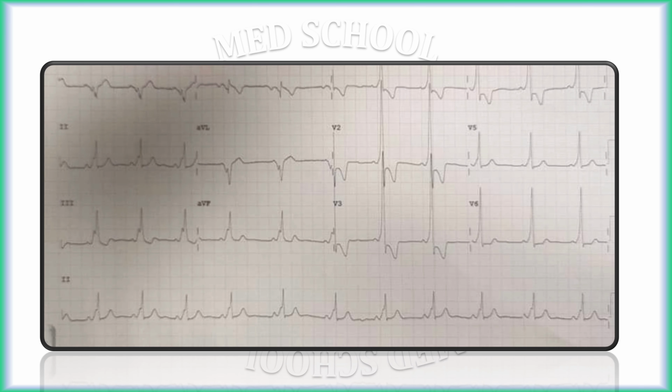This is also an ECG of WPW syndrome. There are ST depression and T wave inversion in leads V1 to V4. These changes may represent repolarization abnormality, provided they are not of recent onset and the patient is asymptomatic.